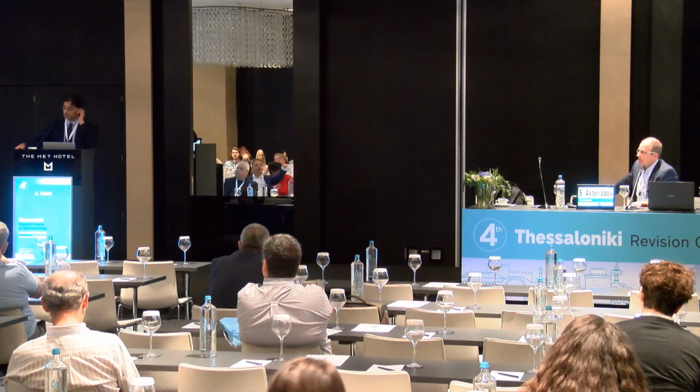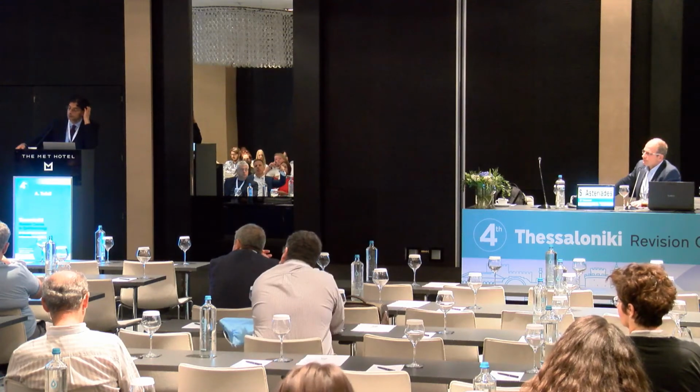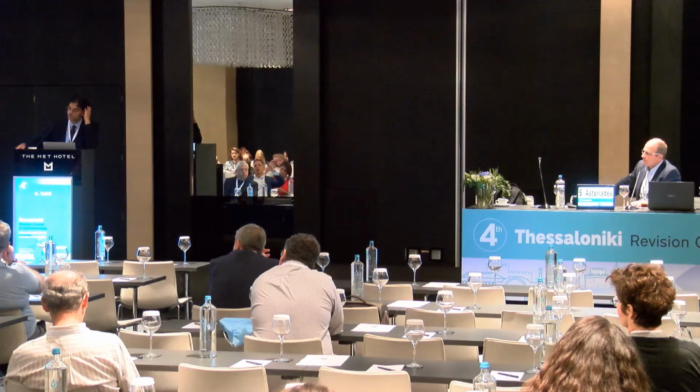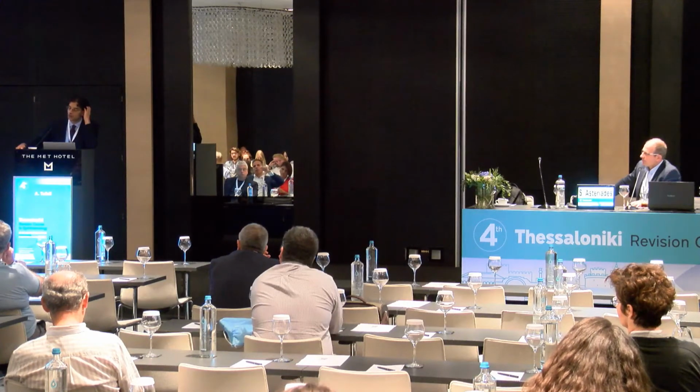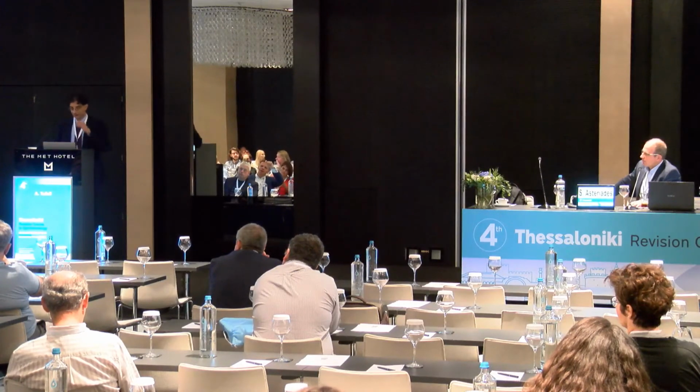Just to follow Solom's question. In a number of patients with PCV, you don't see polyps. So you just see this branching vascular network. Yeah. So you make sure that's not a type 1.